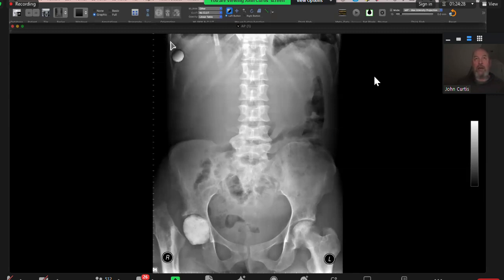And the other thing you didn't mention, minor point, but the patient's got a right pleural effusion, which you can just see here. And then this is a double lumen line, which presumably is for the administration of painkillers, antibiotics, etc. And the last one was this one.